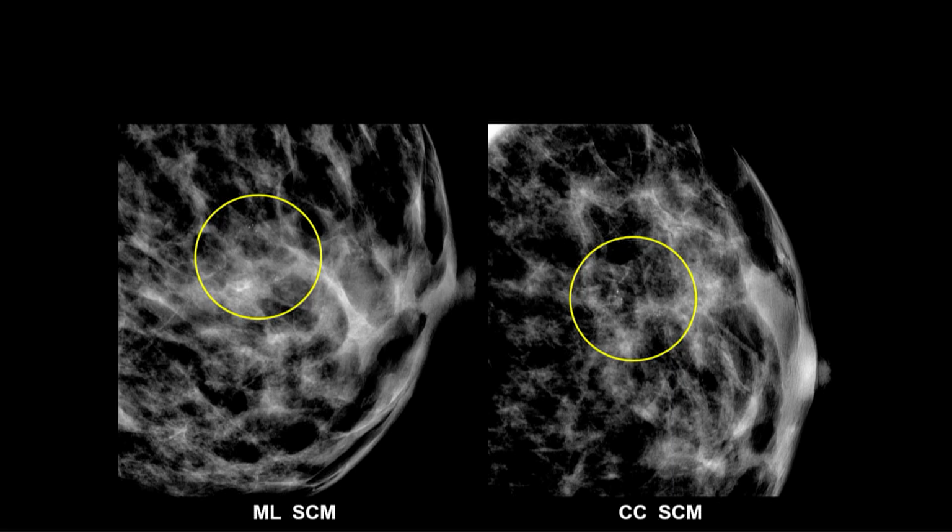By the way, when you're doing a recall and you ask to work up the calcifications in the left breast, look at the whole mammogram. Look at the other side. Maybe at the time when you're doing this workup, you see that focal asymmetry on the other side and say, yeah, they didn't call that back, but I think I'll work that up now. That's fine.